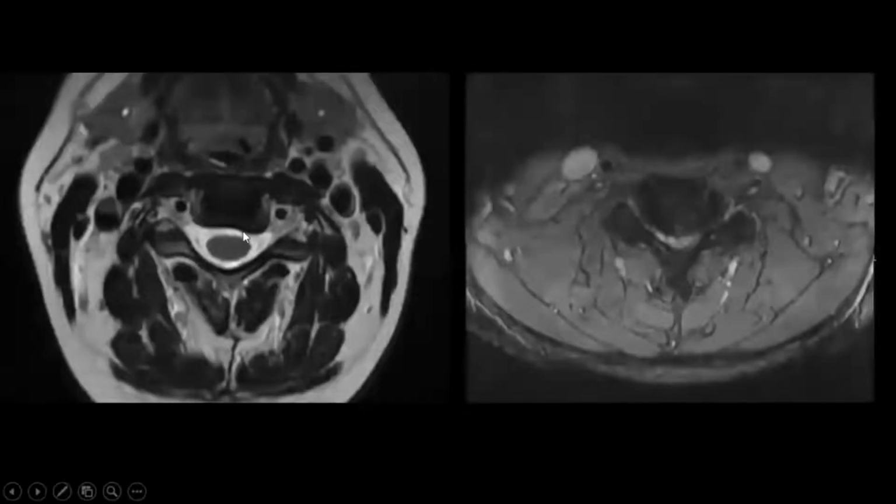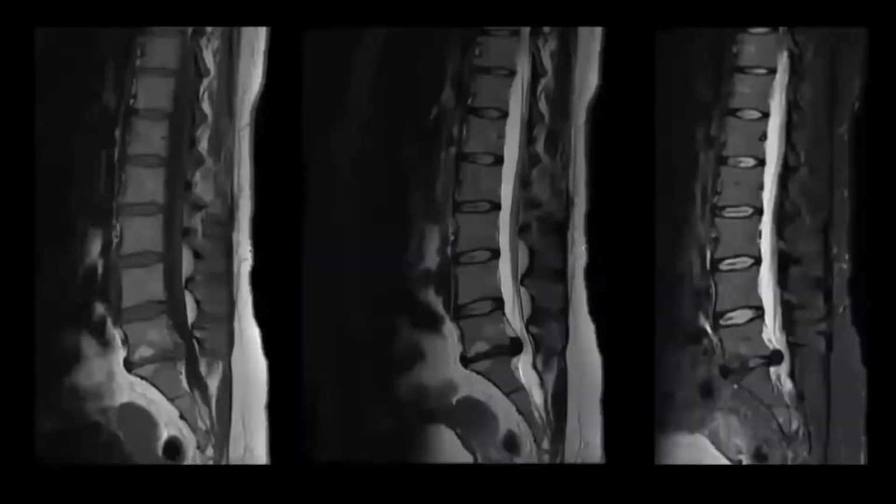To highlight this better, I'll attach a normal image. So this is a normal image and this is the abnormal level. You can see that the neural foramina here are quite capacious and patent. Here you can see that the disc osteophyte complex is almost obliterating the left neural foramen and is causing severe narrowing of the right neural foramen. The central canal, which normally has a circular shape, is deformed here with severe narrowing of the spinal canal. Moving on to disc protrusions.